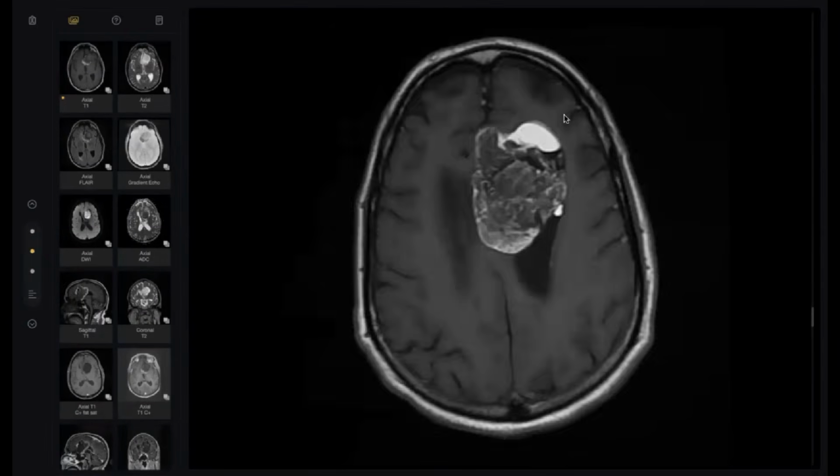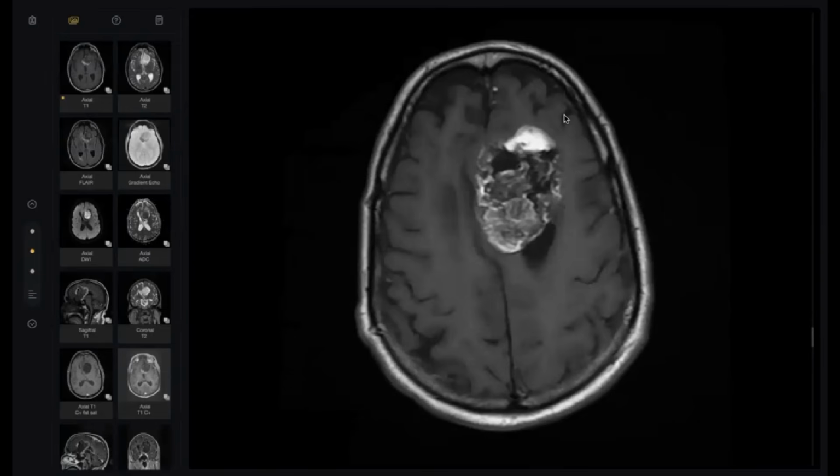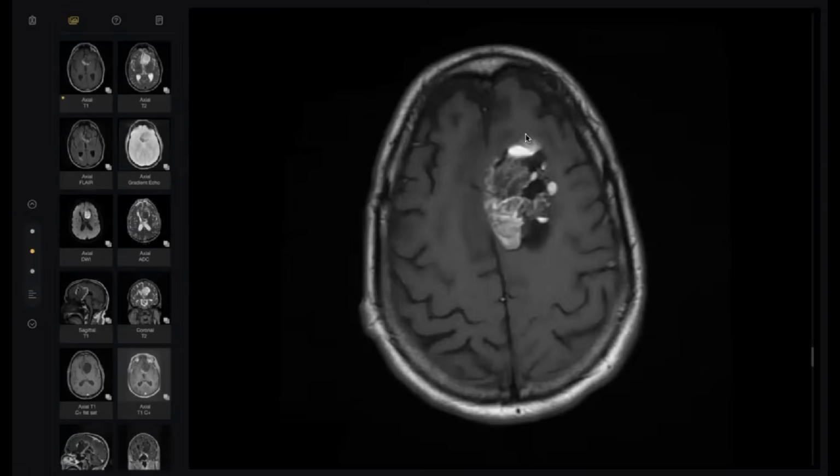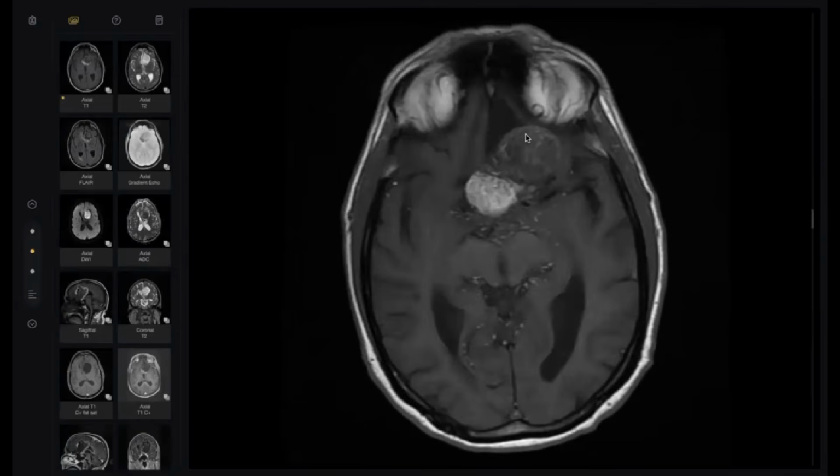The hemorrhage will not be bright like this. And even the patient is lying on his occiput, and the occipital bone is down. So by gravity, what is on top is the fat. Okay. Next one.